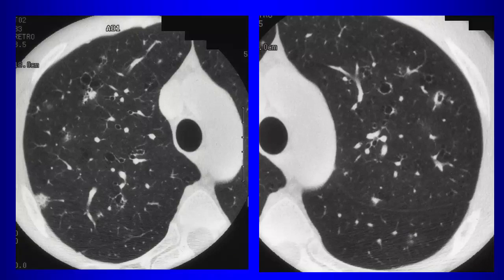Langerhans cell histiocytosis, right? So now, how do you make that diagnosis on the CT? We look for what? Yeah, so cysts and nodules, right? So you have nodules and cystic disease. It's not the best example, but there is a particular sign that's associated with LCH. When you have a nodule like that that kind of looks cavitary with a slightly thickened wall, does anybody know what that sign is called?